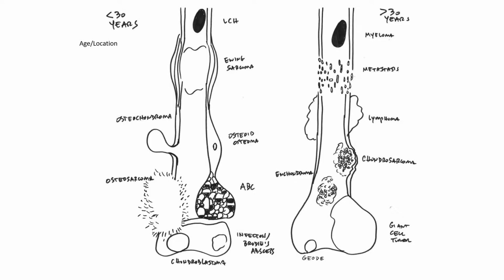But both of these tumors expand the bone, create a periosteal response so that the bone actually tries to hold the bone in. They're known as benign aggressive lesions. They're benign, they rarely metastasize, but they are aggressive enough to expand the bone. They aren't so aggressive that they destroy the bone, but create a slow ballooning expansion. Typically, we talk about a giant cell tumor as an epiphyseal lesion, and an aneurysmal bone cyst can occur in the metaphysis or the epiphysis. The difference on imaging: an aneurysmal bone cyst may have fluid levels in it or several fluid levels, and a giant cell tumor appears to have no specific matrix.